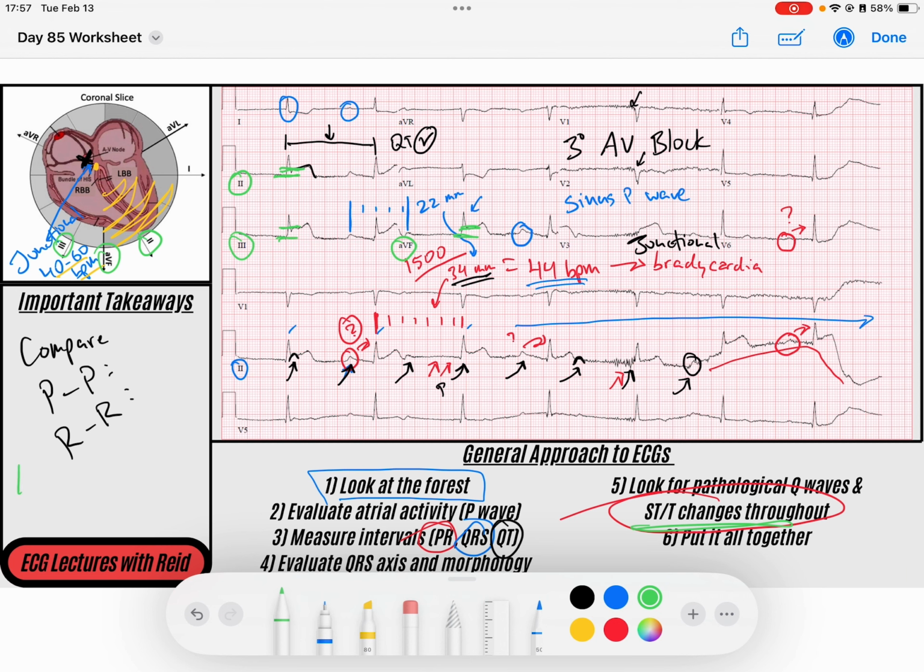So we have inferior ST elevation, right? And that's good in the sense that it's not good, but it's all through a certain anatomical distribution, right? It tells me that there is likely some infarction going on in that region.